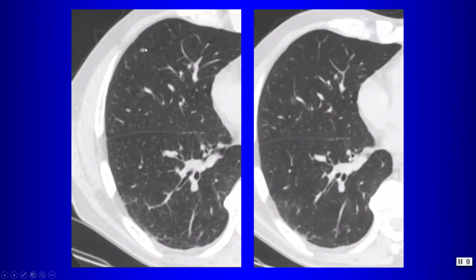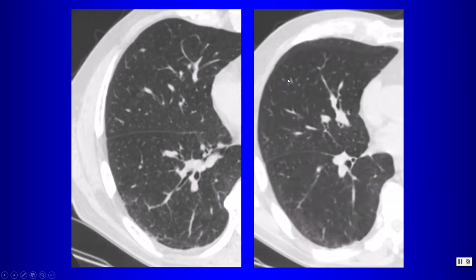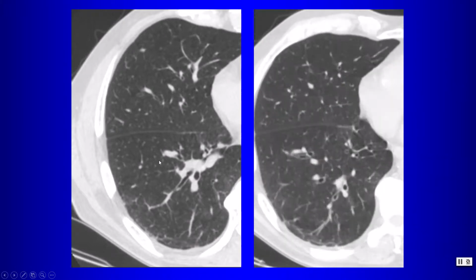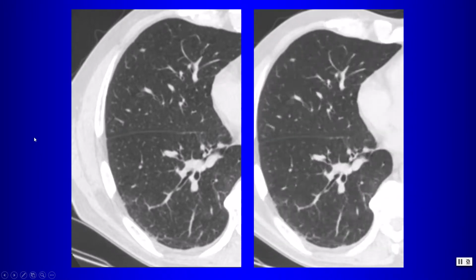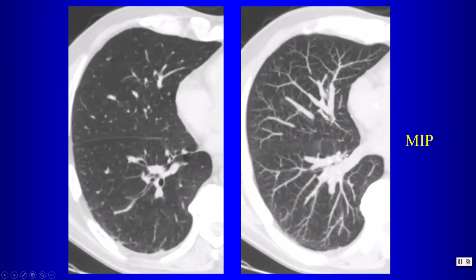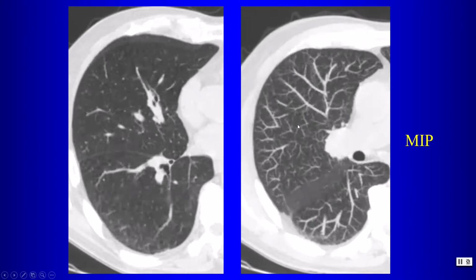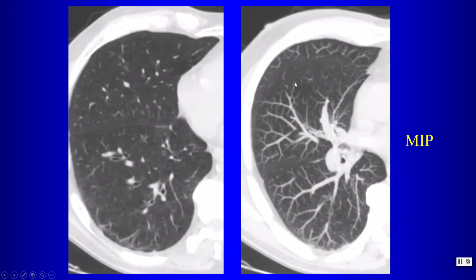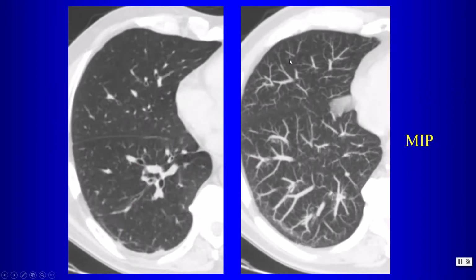Now, these types of very small nodules can be very easily missed as you're scrolling through axial CT scans. So if you're looking for tiny nodules, if you're doing screening studies, what you might also do is look at these MIP reconstructions, maximum intensity projection reconstructions. So a 5 or 6 millimeter slab of tissue here as reconstruction.